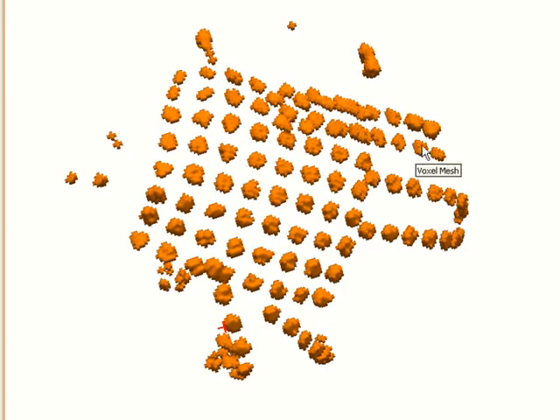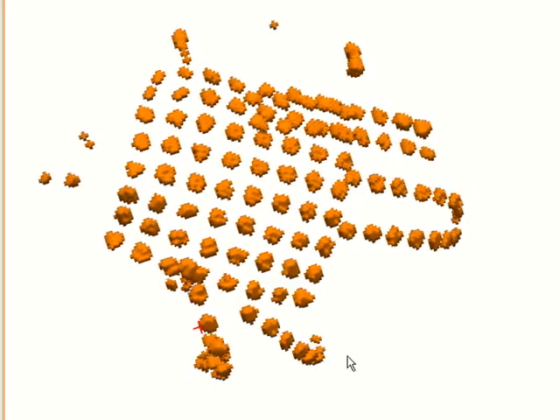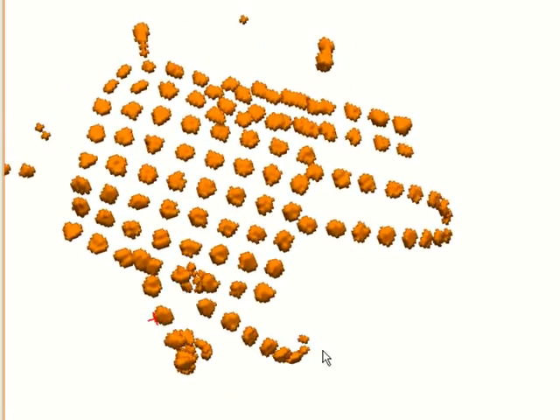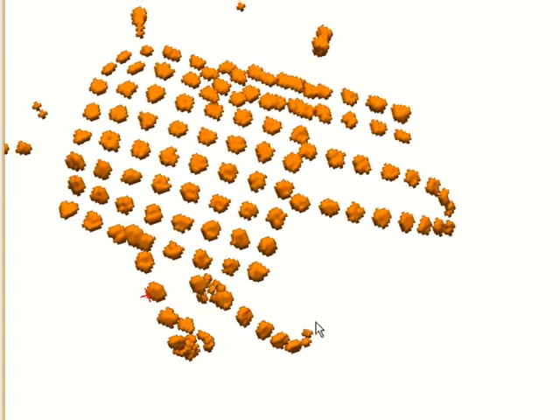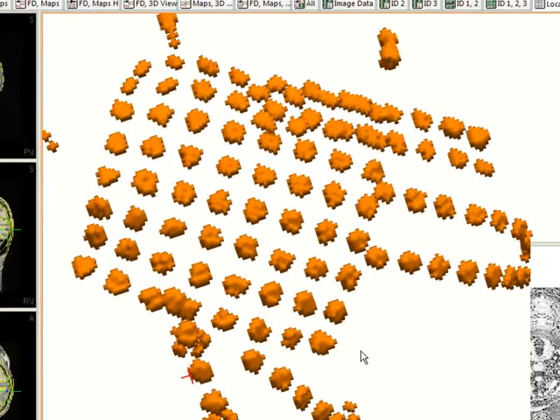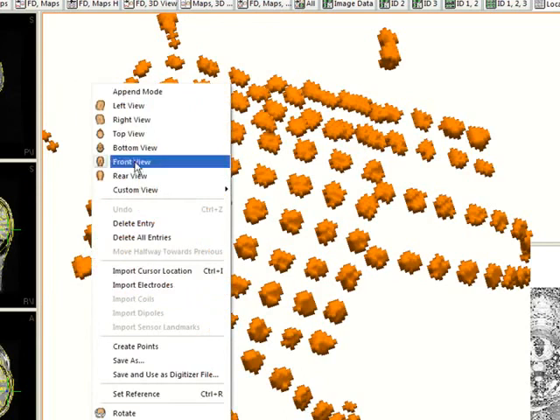We also have additional grids and strips in here, and that makes this one just a little bit more difficult to do than you would normally encounter, but it's not too bad. So I'm just adjusting it where I can get easy access to all the electrodes. And I inadvertently added one, which I'll get rid of.